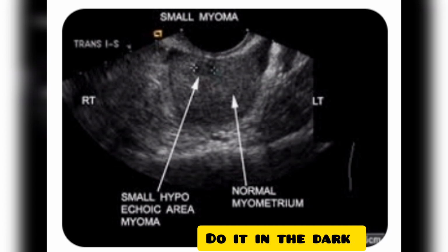Now, another question that usually arises is what causes the specific appearance of fibroid? We have said that the uterine fibroid is a concentric solid hypoechoic mass. So, why is there a hypoechoic appearance? Why is the appearance of fibroid different from other tissues? The answer is that it results from prevailing muscles which is observed at histological examination. The muscles are not observed on ultrasound.